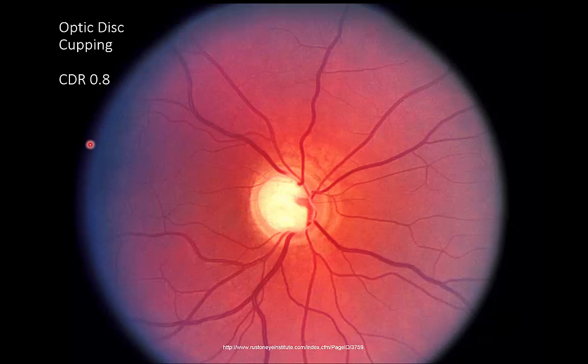Let's look at another one which is even more marked. This is much more marked optic disc cupping. So again, here's our optic cup, which is very large, our optic disc, which now has a very narrow border here, and actually this ratio is 0.8. Nice example. You can see that this disc margin is not blurred at all. You can make out the arteries very nicely. You can make out the veins very nicely. Here's the central retinal vein right here, but we have a very much enlarged cup to disc ratio.